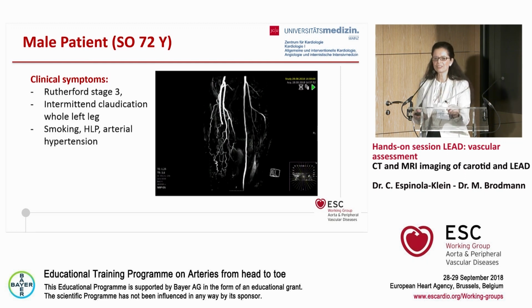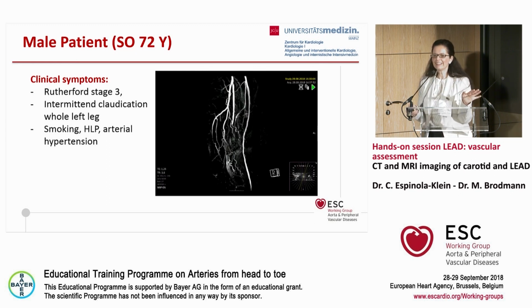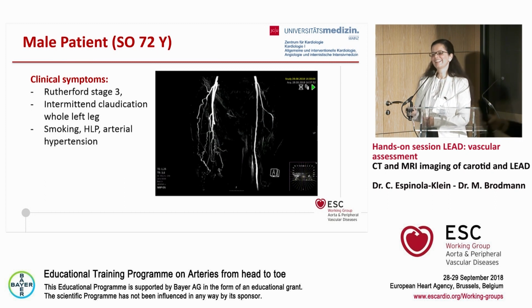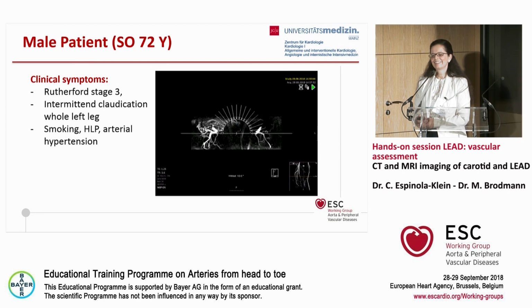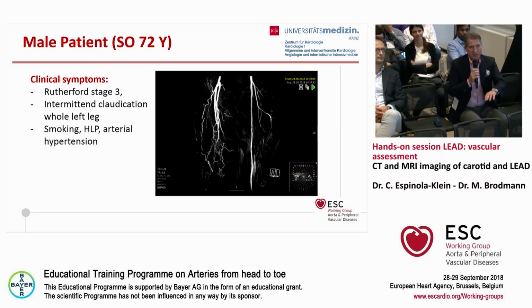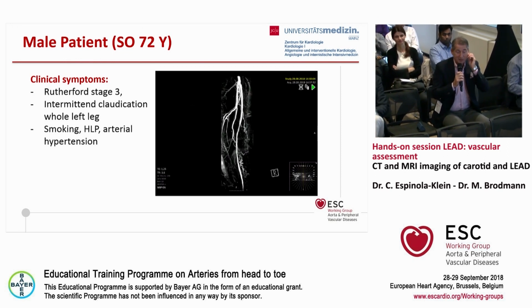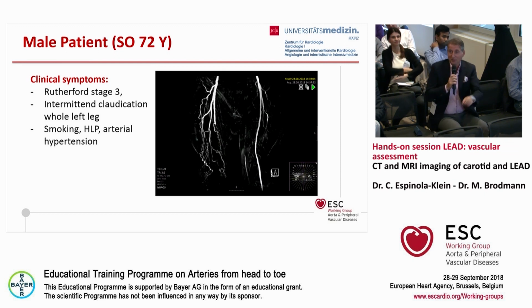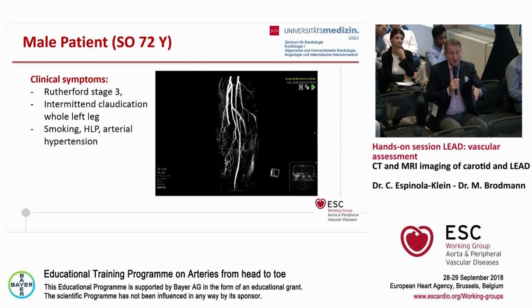Would you do an intervention in this case? Of course. On the right leg? The left leg is clear. The right side? No? Oh, okay. I would do the left iliac and then see the patient. I think an exercise program could be enough. You will have right claudication after treating the left leg, but we can see the patient later.